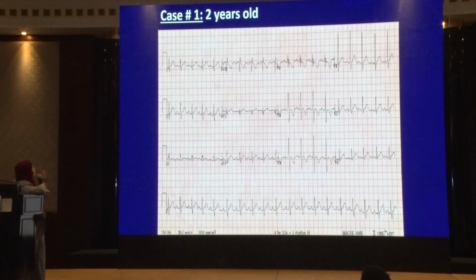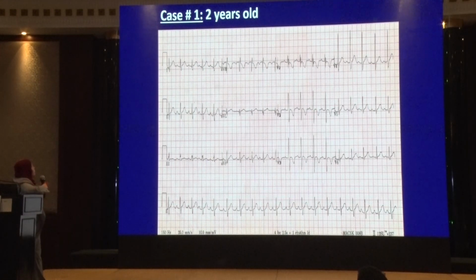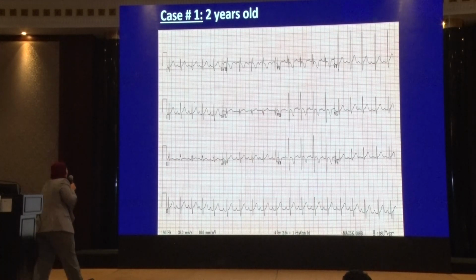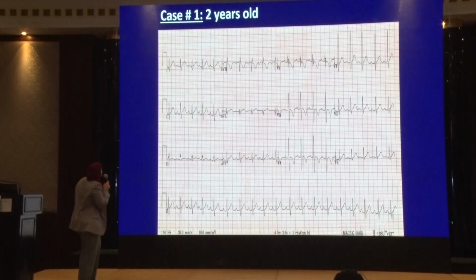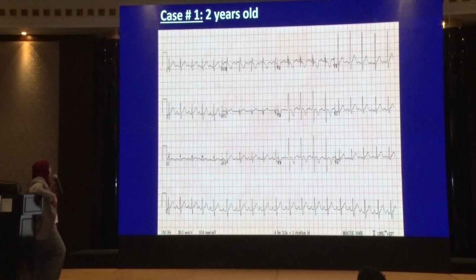Then we have the axis, the QRS axis. This patient is positive in lead 1 and positive in AVF. So normal axis between 0 and 90. Then what do we have again: rate, rhythm, axis, P waves, bravo. We will look for the P waves. Is it more than 2? I think it's fine. In lead 1, it's fine. It's not long, it's not prolonged. Okay, there was one more thing in the limb leads. Q waves. Do we have very deep Q waves? Okay, so it's normal. Okay, now we will go to the chest leads.